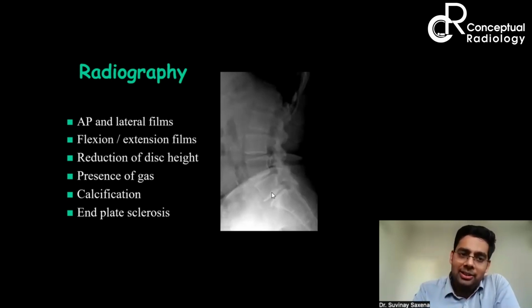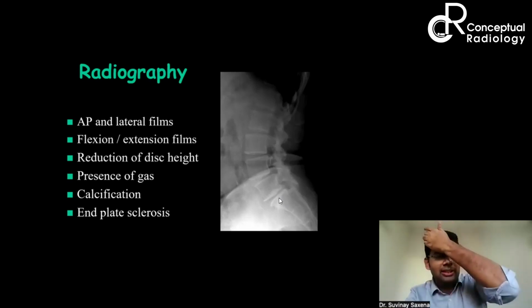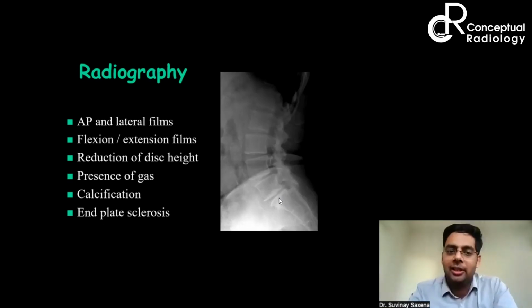I always tell this to you guys because whenever you see the radiograph and go to the MRI, you have a picture in mind. एक baseline image बना हुआ है कि हाँ इस ये लेवल पे कुछ abnormality आना चाहिए. For example, I can see some reduction in L5S1. So when I read the MRI for this, I know कुछ तो L5S1 में गड़बड़ होगा and there is going to be some pathology here and I am going to specifically look for that.